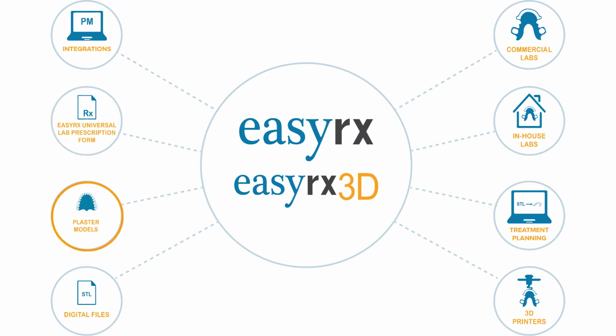You can submit cases to labs with traditional plaster models or impressions, or attach digital files directly to the prescription to send to your labs. With EasyRx, you can submit cases to your commercial labs or your in-house lab. You can also use the EasyRx Aligner Tracking System to track and manage all of your clear aligner cases. In EasyRx 3D, you can trim, base, label, and digitally remove brackets from STL files, prepping them for printing. So EasyRx takes your hectic workflow and makes it, well, easy.